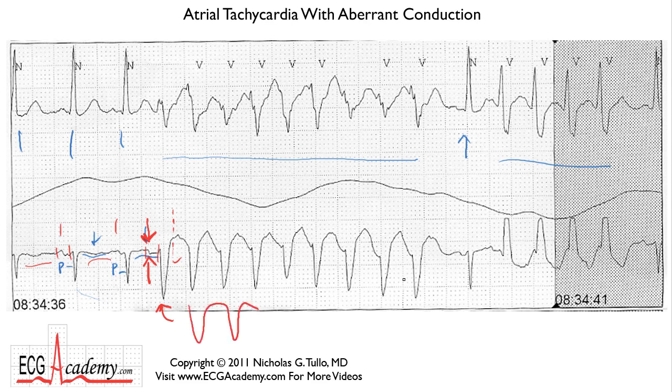But then where'd all these come from? Well, let's look in front of each QRS complex and see if we can identify a P wave. So here's this QRS complex. Is there a bump on the preceding T? Yes, indeed there is. It's right there. And let's look at this one. I think this T wave looks very pointy right here. And here again. And here again. And look, there is a P wave that's clearly identifiable in front of every one of these QRS complexes.